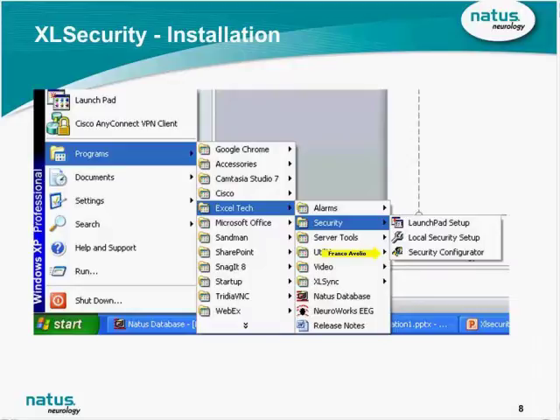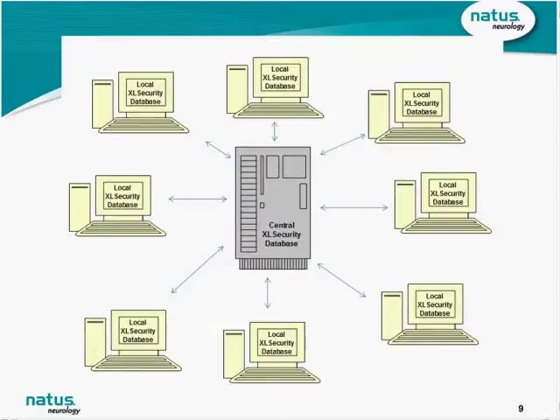So I want to go through what these three modules are all about and what they allow you to do. First off, I just want to speak in abstract terms. The premise behind XLSecurity is that you create a set of rules which people must obey and comply with when they are interacting on the computer. These security rules and guidelines are stored in a central database. Let's look at one example.